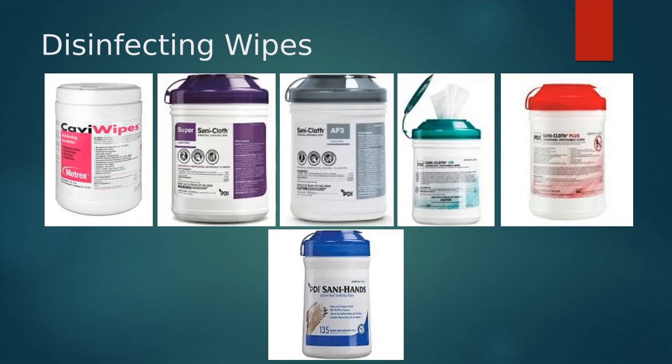Here are our disinfecting wipes. So you're going to see a variety of these out in the clinical setting. Typically in ultrasound rooms, we are using the purple, gray, and green top wipes. The Cavi wipes, the ones on the left-hand side, these were kind of like the old school wipes that we were using for our transducers probably like 5-10 years ago, but they're kind of getting phased out. They're using these a lot for surface structures, so to disinfect like a tabletop or doorknobs, light switches, those things. But we're not really using them as much for transducer and machine cleaning.